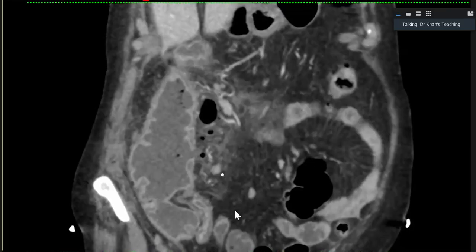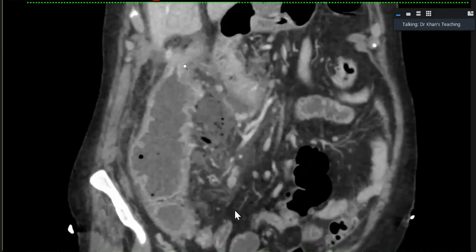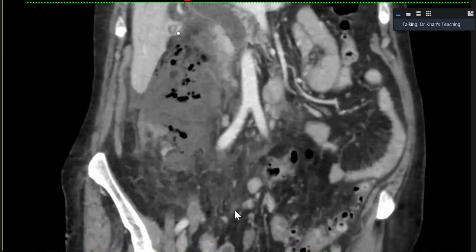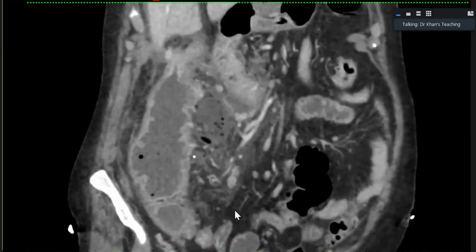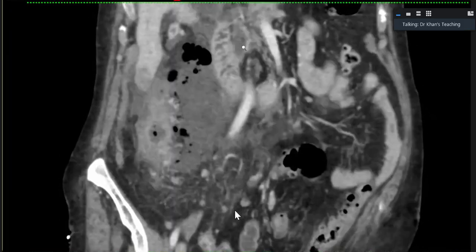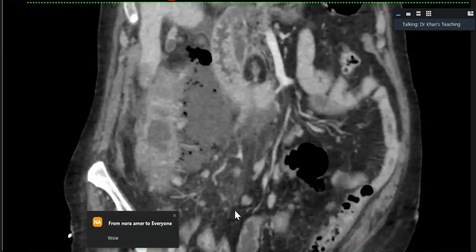This was less than that, but actually this perforated. So the etiology is interesting, and that is what this case is about. You see this and this, how it fistulates and how this makes this. Of course, there is biliary dilatation and all those things, but I was not interested. I was mainly interested here. Okay. So next.